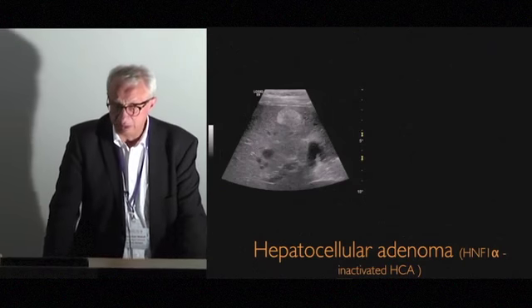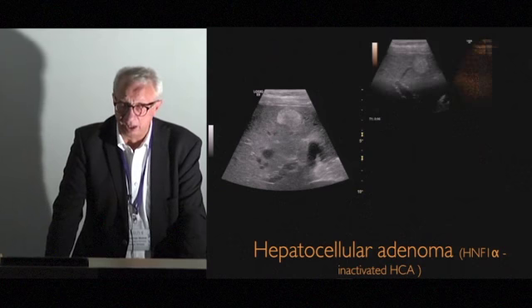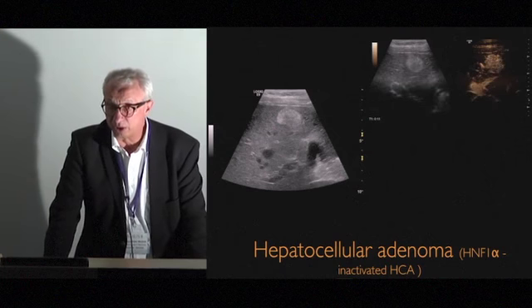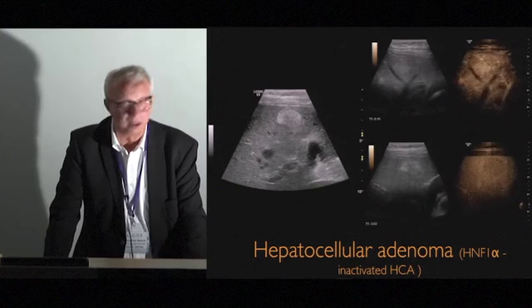This is a hepatocellular adenoma. This is the HNF1 alpha inactivated HCA. Okay, it's fatty liver, it's fatty tissue. And when you look at the contrast, it takes up contrast, but over time, it starts to wash out.